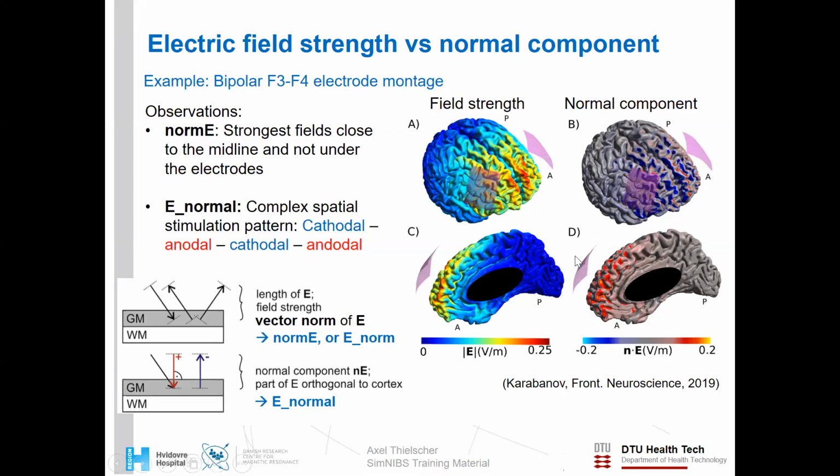which makes the interpretation of this whole montage relatively complicated because, for example, areas in this region are thought to be really important, as they are affected when people suffer from depression. So even though this montage was initially designed to stimulate the DLPFC, it most likely does much more complex things.